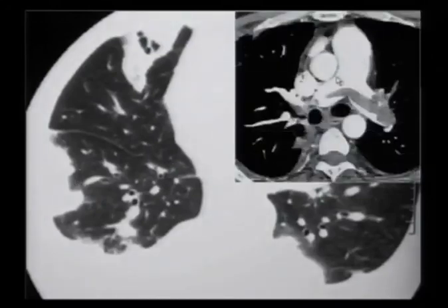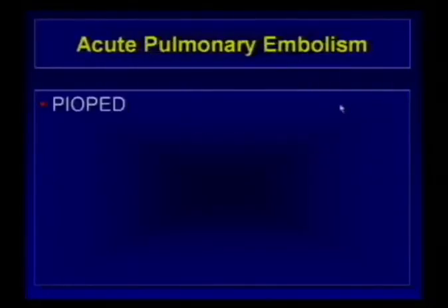Here's the CT scan, really shows the same thing, and I think to a little better advantage than the plain film shows. Subpleural consolidation, when we use that word subpleural, we mean something's out touching the pleura. Peripheral means it's out in the outer third of the lung, maybe it touches the pleura, maybe it doesn't. So subpleural is as peripheral as you can get without being in the pleura. Subpleural consolidation, a little area of cavitation here, again, roughly triangular shaped with the apex cut off facing towards the hilum. And that's a pretty classic description of a pulmonary infarct. This is what his mediastinal windows look like with a nice saddle embolism here. So PE, something we see every day.